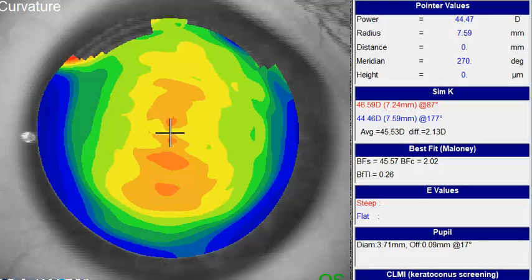From your request, I could see that you have a lens that's standing off in the lower section of the fit. So if we look at your topography here, you can see obviously you have a toric cornea. One of the first things to remember, sometimes when you have a cornea that's slightly steeper on the bottom versus the top, slightly asymmetric, this is not too bad, but a little bit asymmetric.